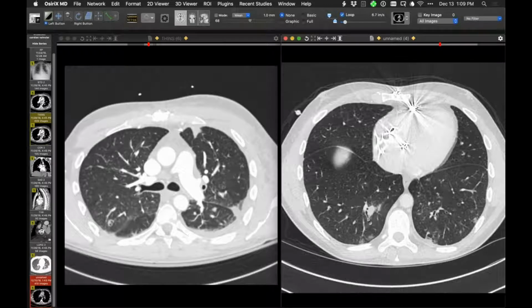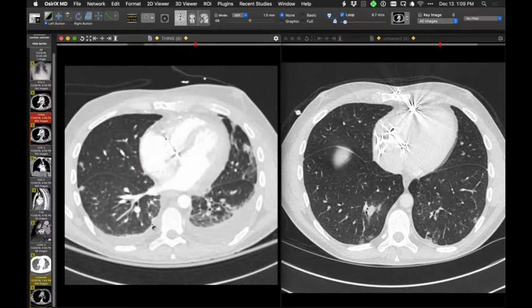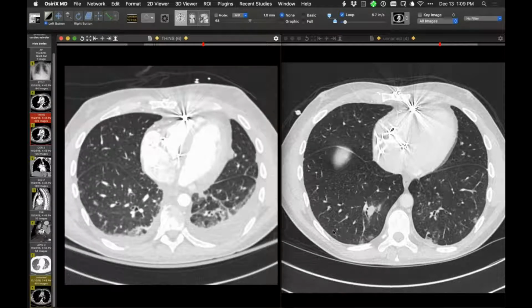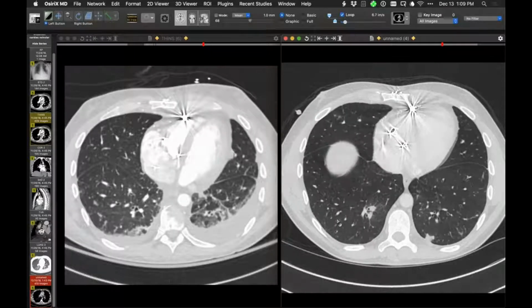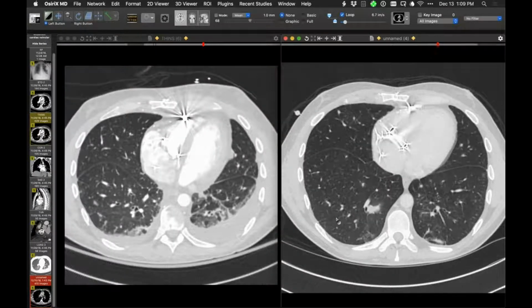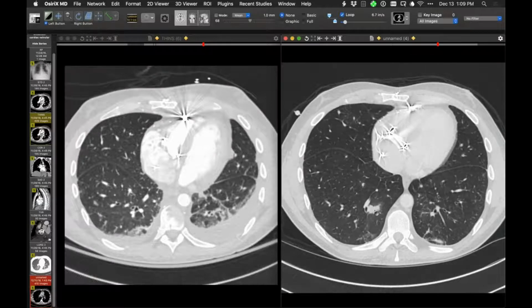Yeah, I don't know, Jeff. I'm glad you brought that up, because like we talk about all the time, that expansion of the vessel is a good clue to the presence of acute pulmonary embolism. And so I was thinking maybe it was just more embolic stuff that is expanding the vessels, but yeah, this may be causing inflammation around it too. And remember, this is the guy with the large tricuspid valve vegetations. And I was thinking before that he had embolized vegetations, not bland emboli. Right. So that's really interesting, isn't it?